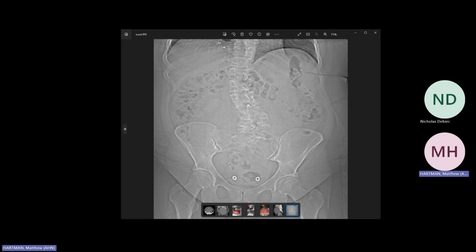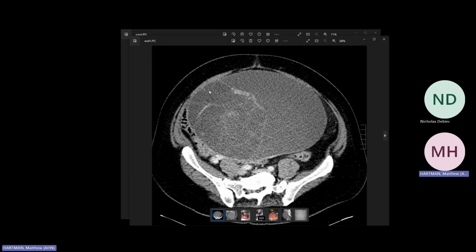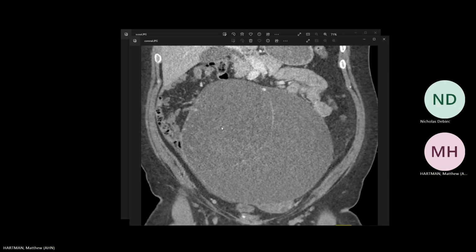This was about a 55-year-old female. Belly pain, so stones, bones, mass, and gas. Maybe a mass here. We'll see. We'll go to the truth machine, which is the CT scan. And what do you know? A big mass. We'll talk about how to work these up, but one of the big questions is solid versus cystic. Put Hounsfield units, you get about 10. So we're thinking cystic. Here's the coronal.